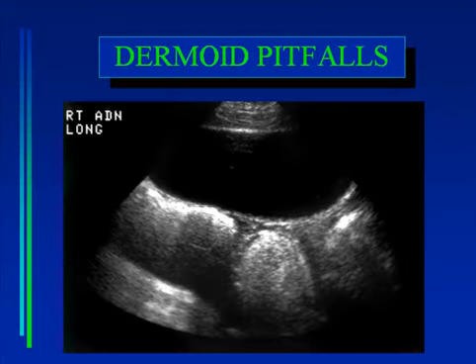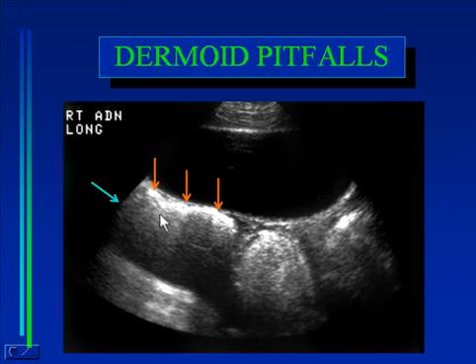On this image, we have both echogenic bowel as well as an echogenic dermoid, so that you can see the differences within them. Here is the bowel. The bowel will elongate if one twists and turns on it, because after all it is a continuous structure, and the bowel will abruptly shadow, so that you won't see a lot of the leading edge of the bowel, as we see here, and often the shadowing will have a lot of artifact in it, so-called dirty shadowing, due to the shadowing being from air.